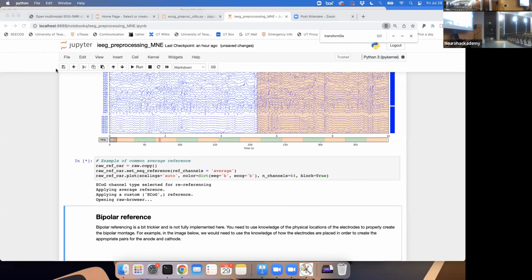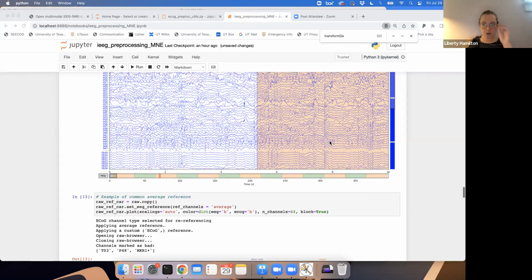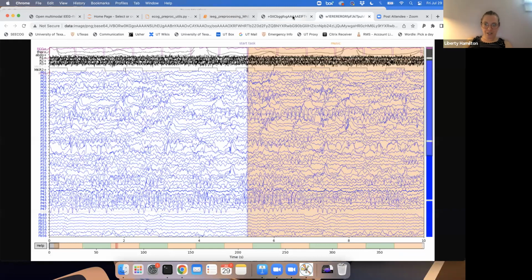And so here you don't see any flat electrodes. In fact, just looking at this, it might be hard for you to see a difference between that and the other one because they're all just squiggles. But I'm going to show you a couple of things. If we open this in a new tab and this in a new tab, then you can see the difference. If I flip back and forth between the two, you can see some similarities and some differences.